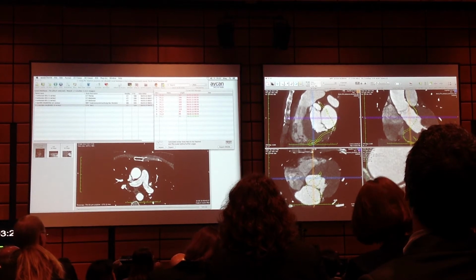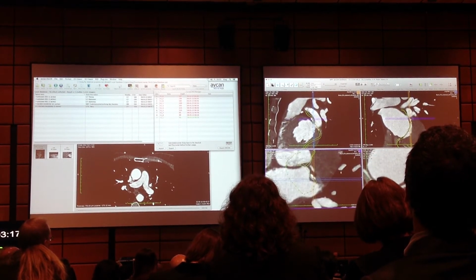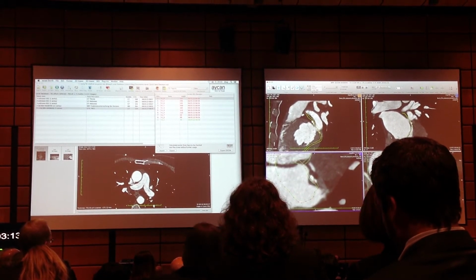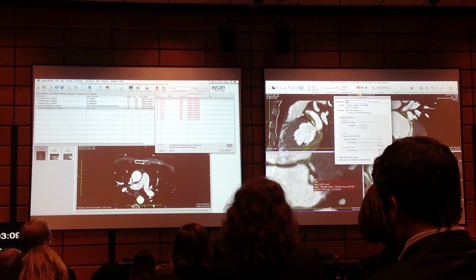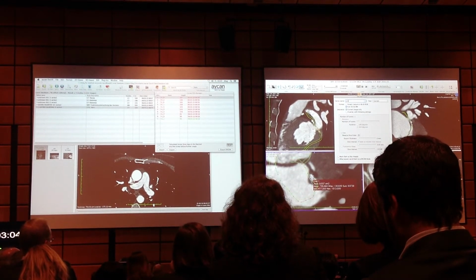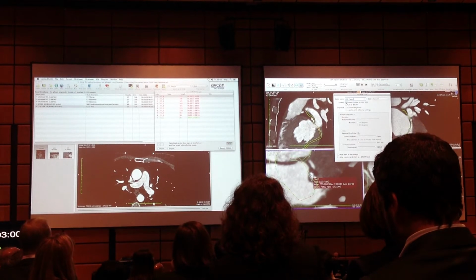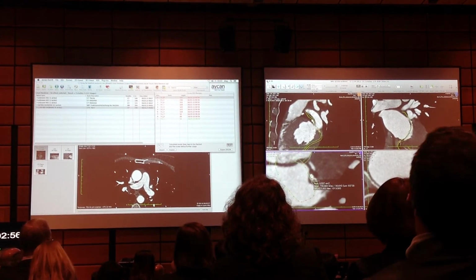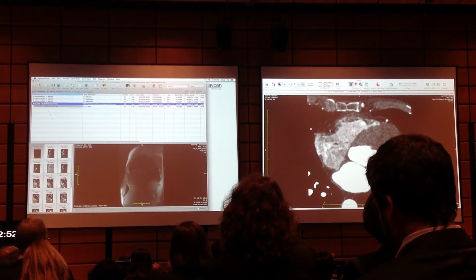And there was also a task to quantify or to show the calcified plaques, and I can just do a ROI measurement in here and also export that to PACS to give the clinical colleagues an idea about it. So that was the CT case. We go to the MRI.